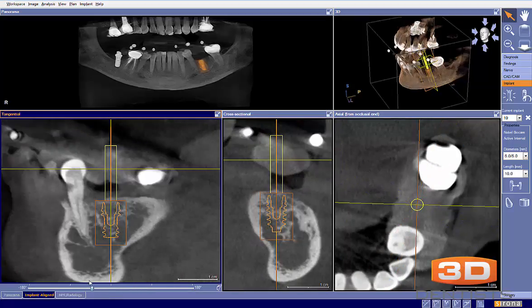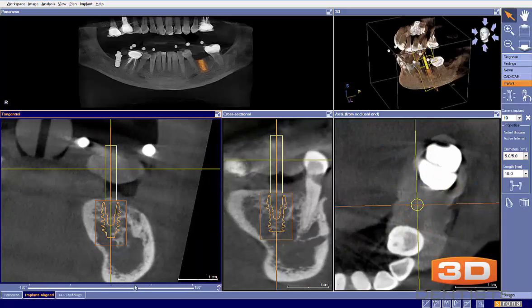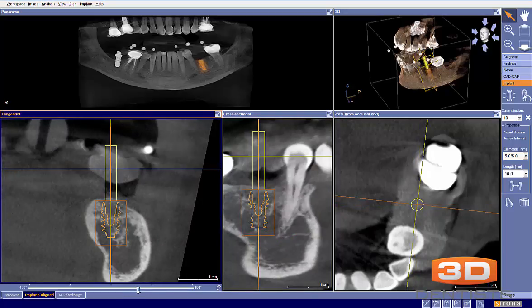And then we'll take a look at the inferior alveolar nerve. Sometimes it's going to be hard to visualize it all the way, so sometimes we're going to guess. Right here, what I'm already seeing is there's my nerve. Okay, so at least there's part of the nerve, right? Mentally, that's kind of what I do. I would probably even say worst case scenario, it goes up like that. I would say, you know what, that's probably a little too close for comfort for me.